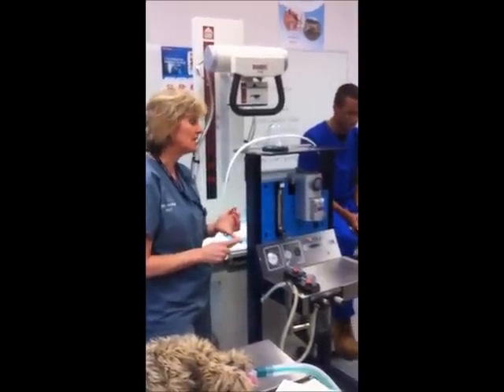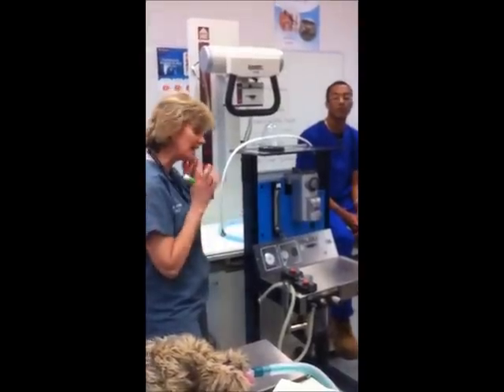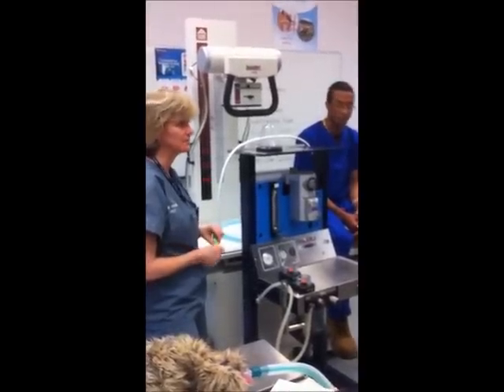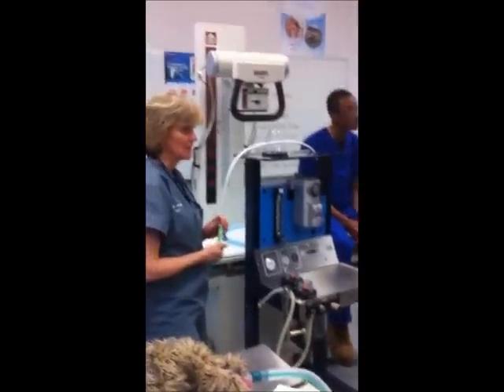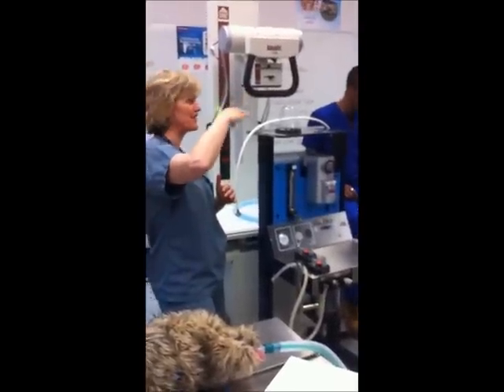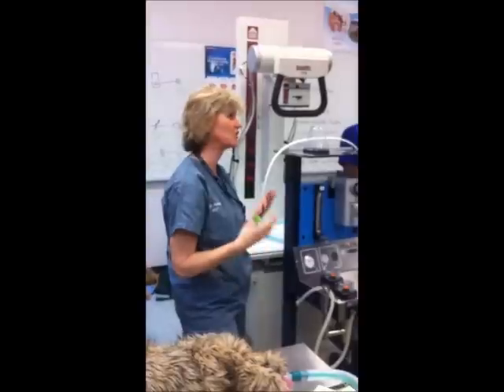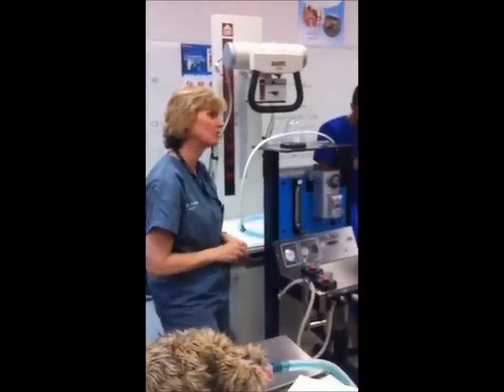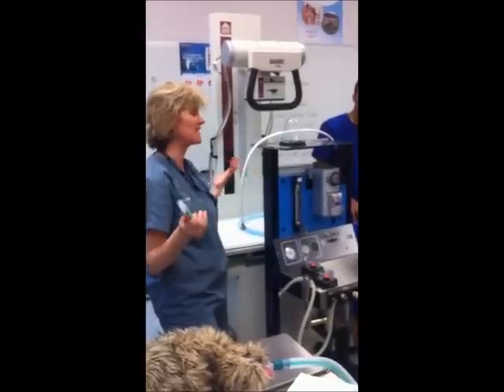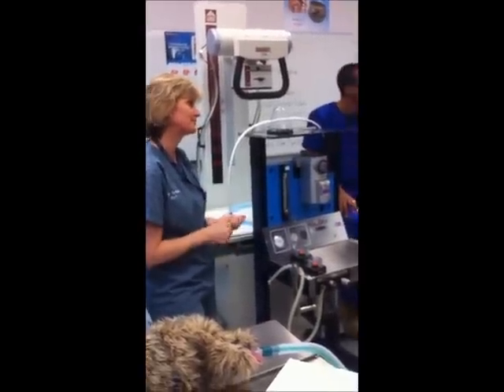Now, a lot of this may also be involved in the written test too, but that's exactly what you can expect on the practical in here. How much are those questions worth? Well, normally in a rubric there are usually 5 things on there, such as set up the machine properly. One of those says, did you answer the questions properly? So it represents 1 mark out of 5. Not that much. 2 questions total, 1 mark out of 5.